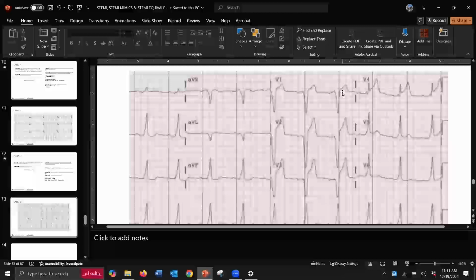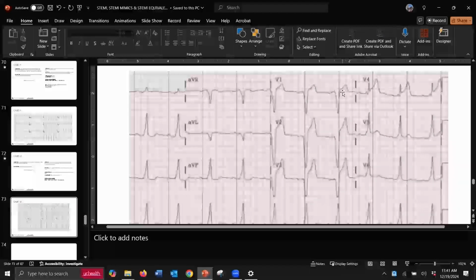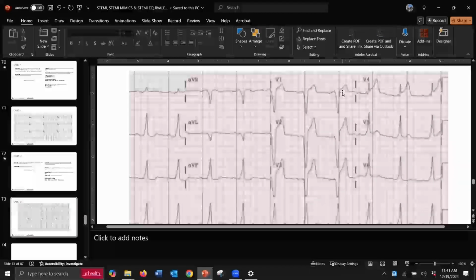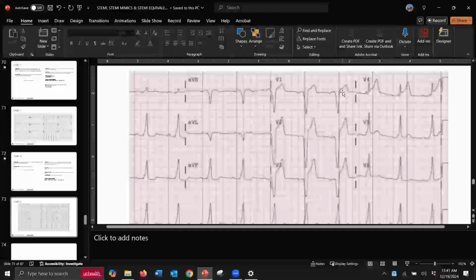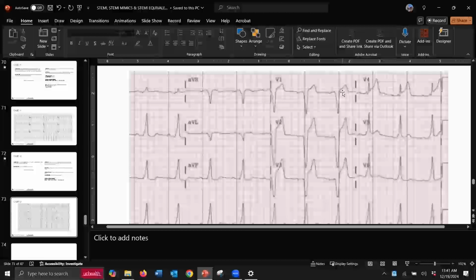So left bundle. What do we do in left bundles? Okay, so you're gonna have to identify it. I'm gonna call it a, because it's left bundle. What do we use? Anterolateral. It's because I got the concordant ST elevation in V4, and then V2 has enough, from what I can see. What about lead 2? Lead 3 is ST depression, discordant.